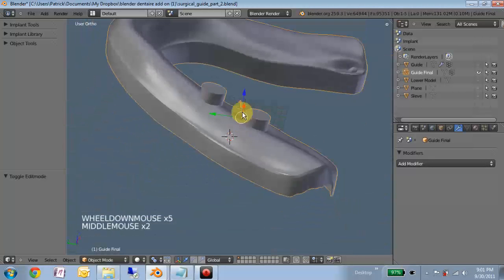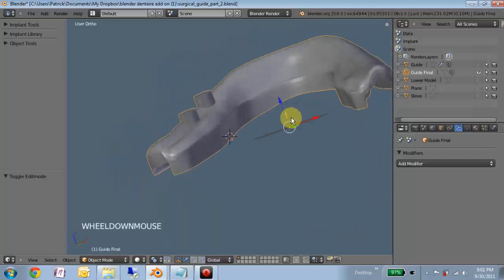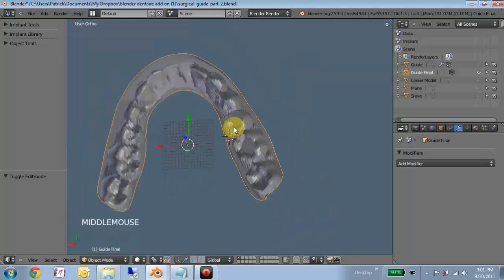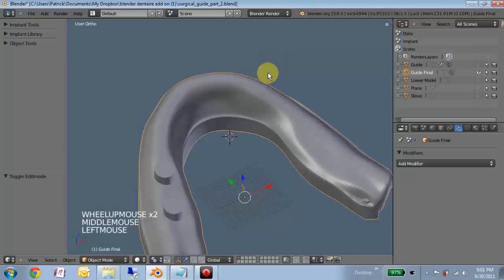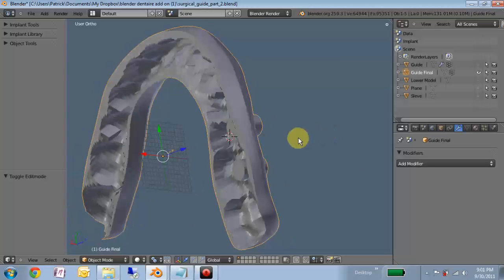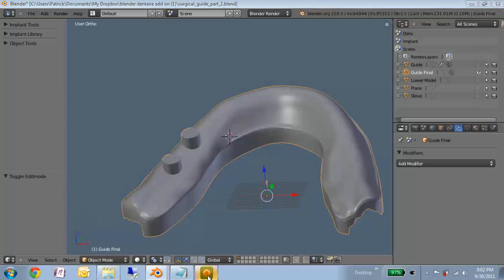and what we're left with is a perfectly manifold surgical guide, which has our drill guides and all of our occlusal information. Of course, we're assuming that these teeth are gone and that we're going to place implants here. But just as to develop the method for this, that's how I would do it. I think we can script about 80% of it so that it's just a couple button clicks. And that this concludes the screencast.